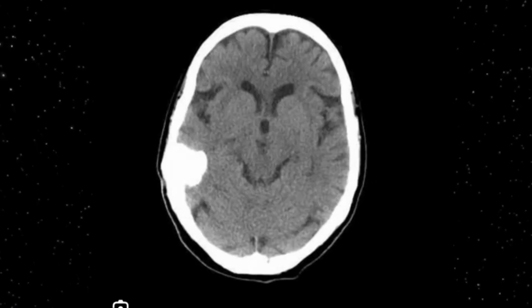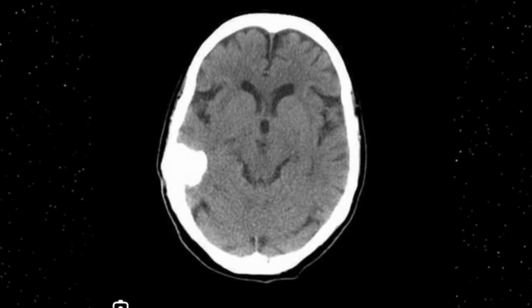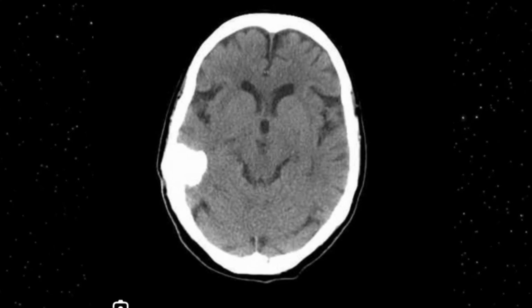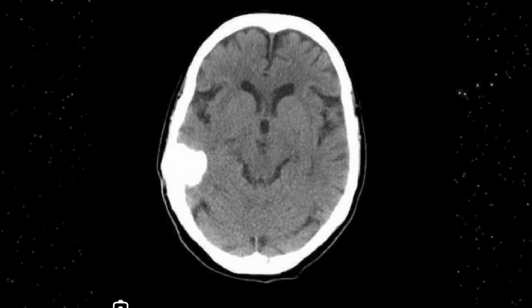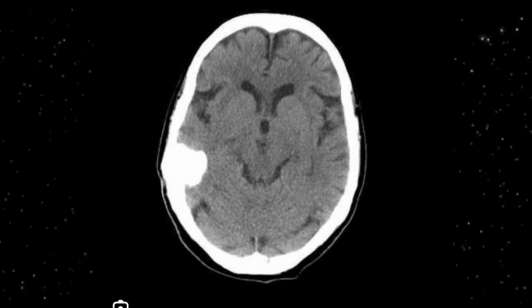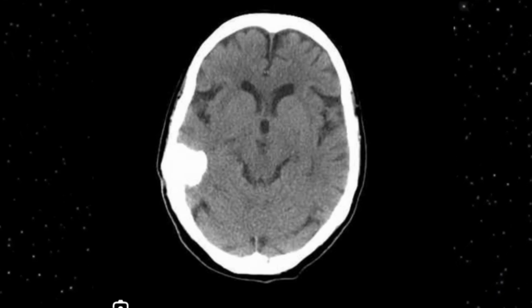Another example of a calcified meningioma on the axial CT images, involving mainly the temporal region. In this view, you can see the Sylvian fissure there. However, the surrounding edema we cannot appreciate on that image. For that you have to have the MRI for two purposes: to appreciate the dural tail sign and to see the vasogenic edema. However, in this scan you can just see that there is a calcified meningioma, which is quite easy to diagnose.